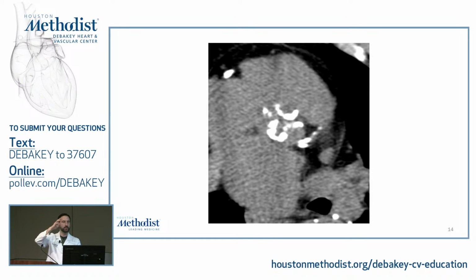It can either be done manually, or if you click a single click, it will identify all that calcification. But be careful when you do single click, it can incorporate some non-aortic valve measurements. So I will do manual and just go up, down, up, down, until I make sure I encircle all the aortic valve calcium, and then the score will give you an Agatston score, and you just report it.